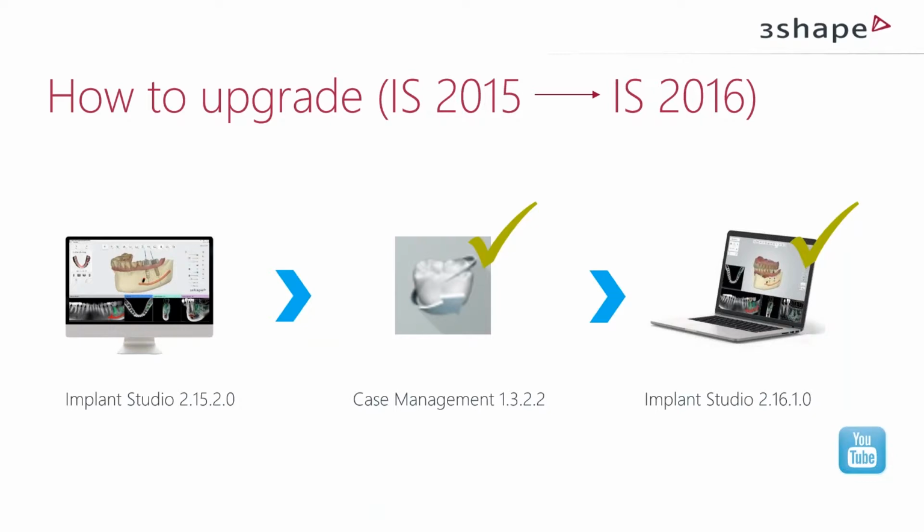I will repeat one more time. So Implant Studio 2016 version requires three modules to be installed. They are called Implant Studio, Anatomy Design, and CAM Export, which will be actually Save module. No additional licenses are required, so only Implant Studio Full Solution license is needed. And these modules will run only within Implant Studio workflow.